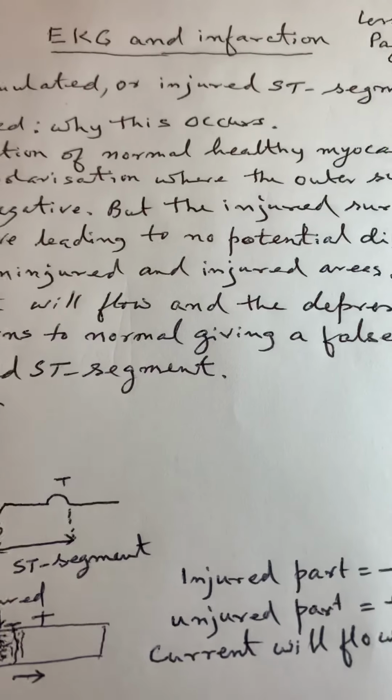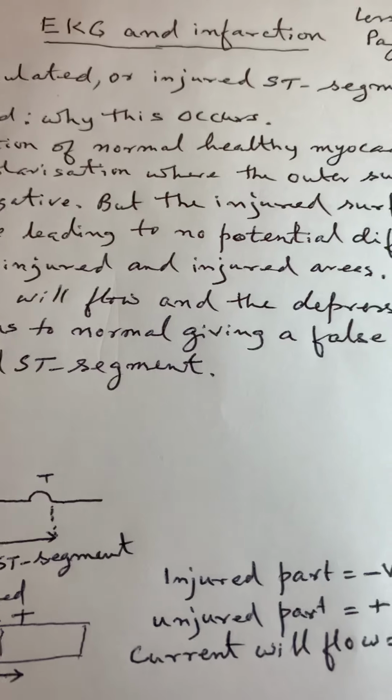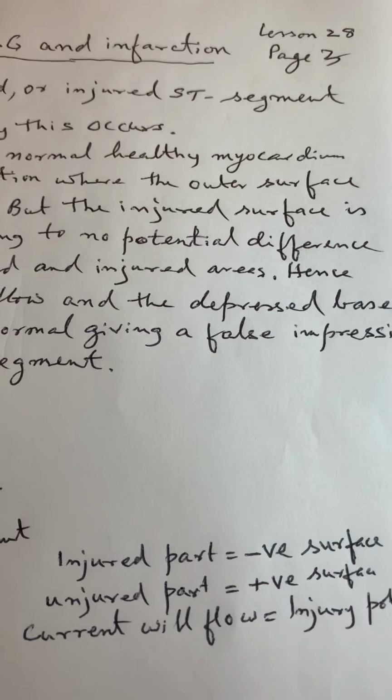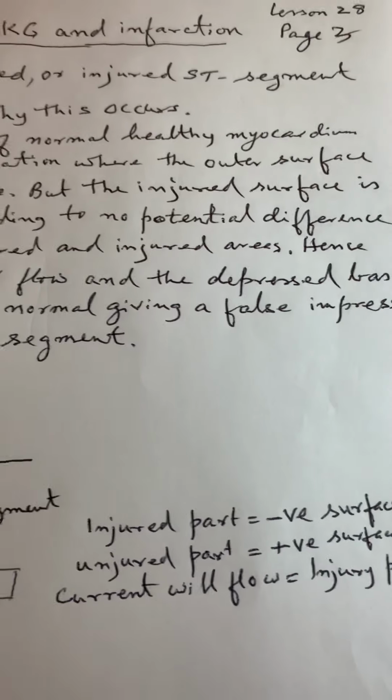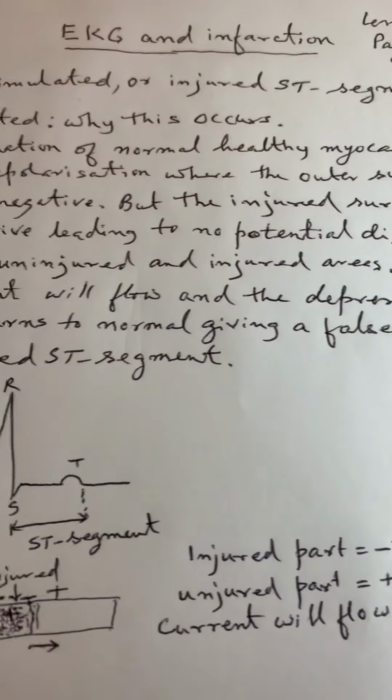This is ECG and infarction, lesson number 28, page number 3, in continuation with the previous 2 pages.